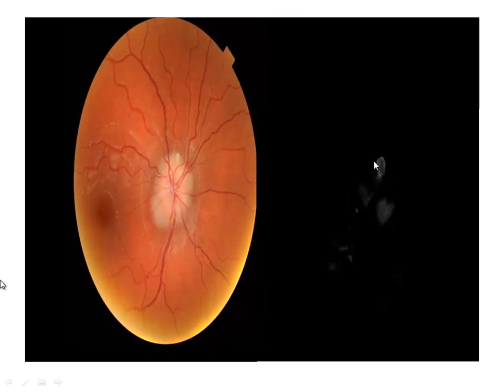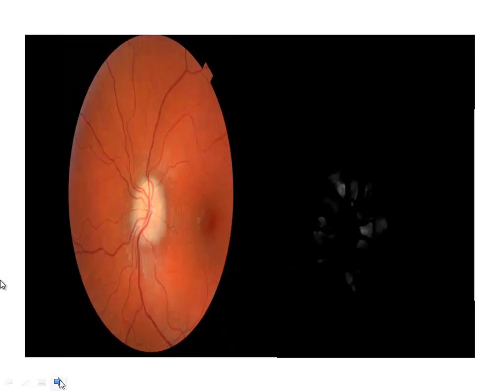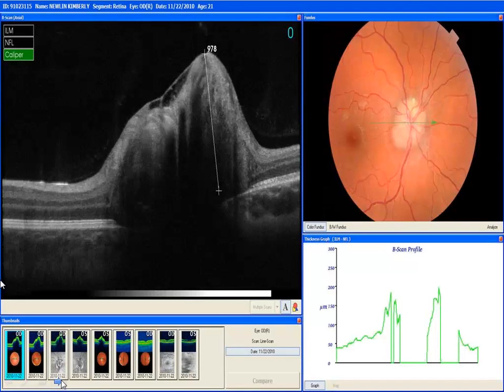Here we have an autofluorescent image taken with the filters of the standard 3D OCT 2000 Topcon system, and that corresponds to this. We can go a little further in the left eye, and then also look at this pseudo-autofluorescent image, if you will, and those highlight. You can see those correspond. That's really the same size, so you're going to see 2 of those at least when we actually start to do the OCT. So patients with disc drusen have elevated disc borders, but so do patients with papillitis and papilledema, so that's not helpful in the differential diagnosis.